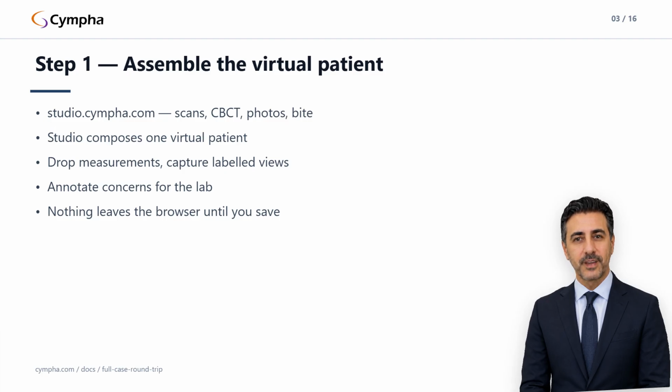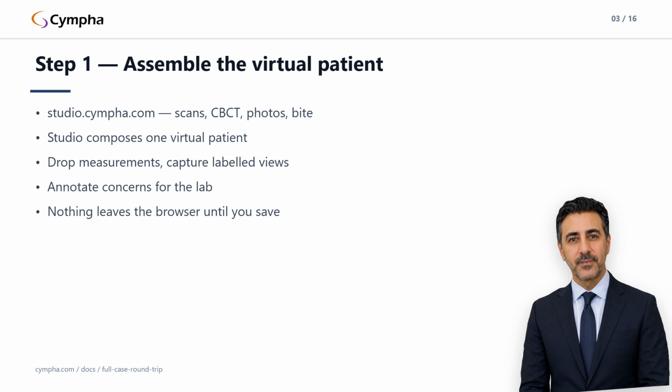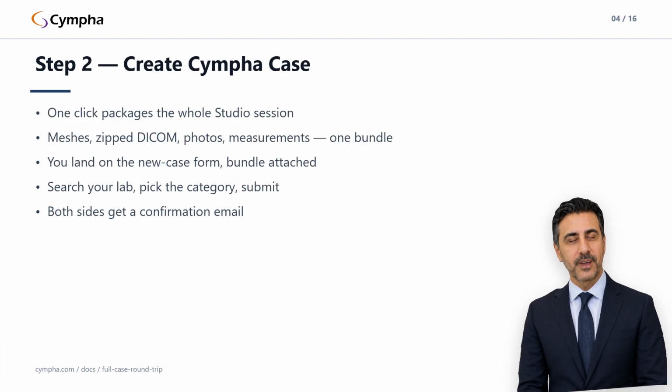The clinician clicks Create Cympha Case in Studio. Studio packages the entire session, the meshes, the zip DICOM, the photos, the measurements, into a single case bundle, and uploads it through the same Cympha account they're already signed into. No export, no file manager, no second login.